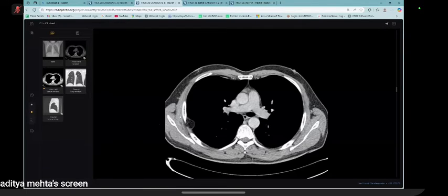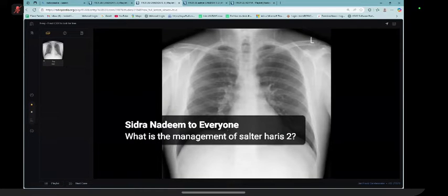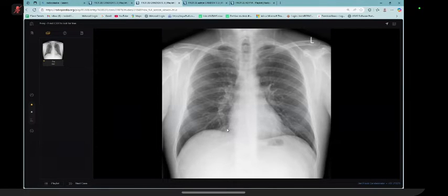All right, a few things. First of all, you just missed something. Whenever a non-specific case like this comes up, first speak as per the clinical question. There is abdominal pain, and an erect chest X-ray. The first finding you should look for is always pneumoperitoneum, or air under the diaphragm, because the main concern is the abdomen. We are not here to detect diagnoses, we are here to manage a patient. So you should say that there is no pneumoperitoneum or no air under the diaphragm. That should be the first wording.